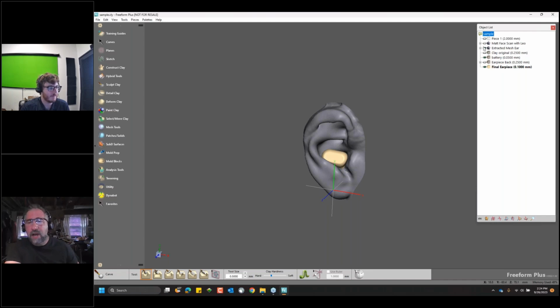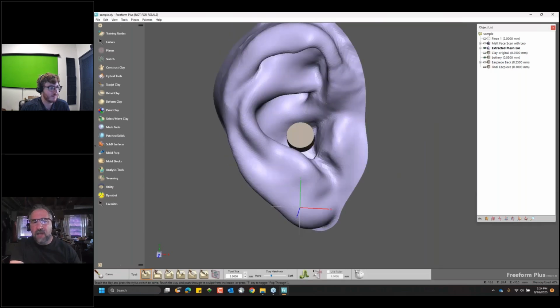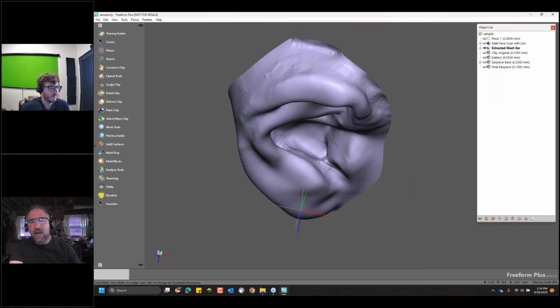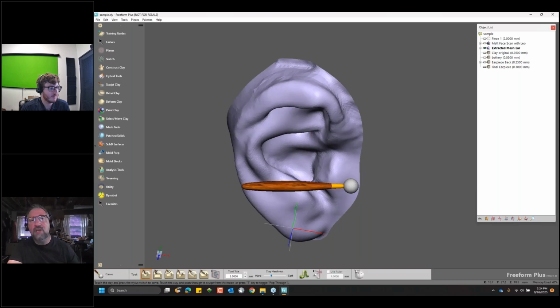Since I can hide this ear, you can see that this model now will conform to the inside of that cavity, where there was a standout for a battery. And of course, the high resolution of data, the excellent scan that was done, does give us a small view into the ear canal. So we have everything we need to make a hearing device.